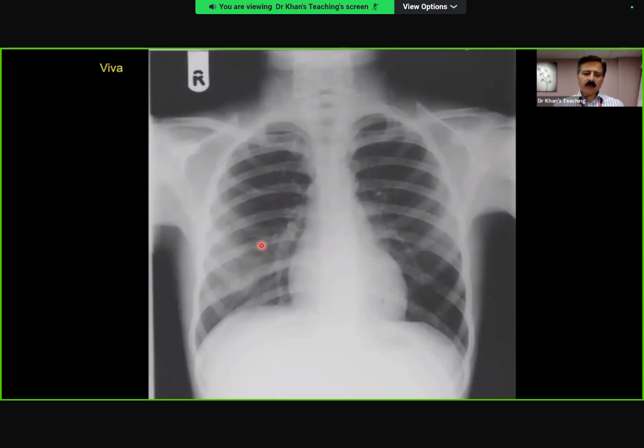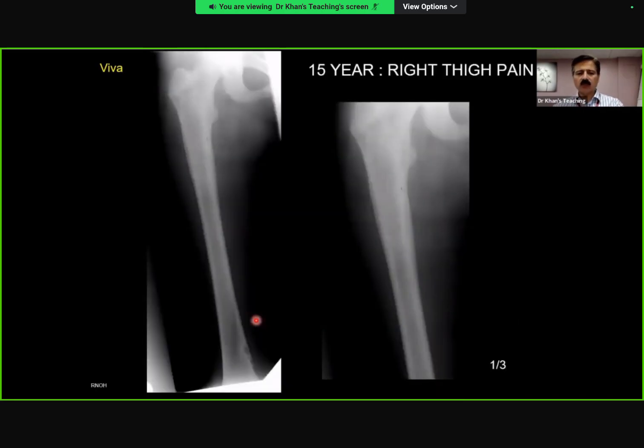And then you pick up, there is something wrong, and initially you think there is consolidation. Look carefully, there is soft tissue thickening. And then you look at this destruction of the bone. So it's a lesion presenting like this. Classical differential will be the same. The top 2 will be infection versus Ewing. So they have to be on top. You can keep eosinophilic granuloma, LCH, etc. in the differential, but those will remain.